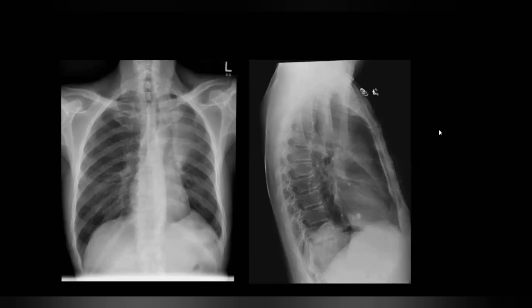Okay, great. Now, to make your description, particularly as you are doing it now for the exam, it's always important to be proactive. You mentioned that there is left upper lobe collapse. This could be related to a central mass. Now you have to take this further, and you have to tell the examiner that this is a suspected cancer, or a suspected finding. I have to call the physician and tell him, because unfortunately, many times we see a finding that is ignored by the radiologist or the physician, and the patient may come with advanced disease that is beyond curative treatment.